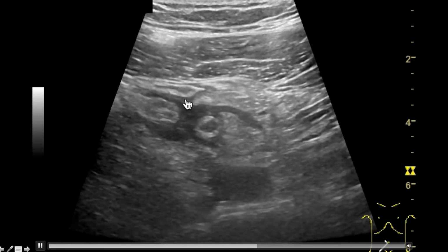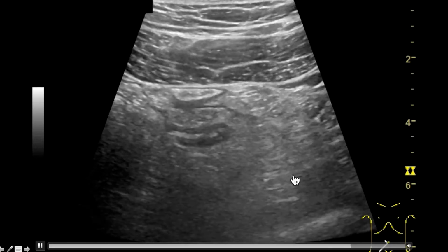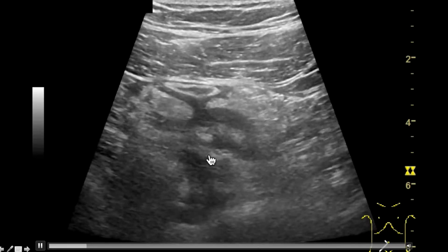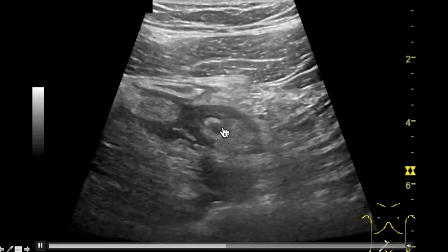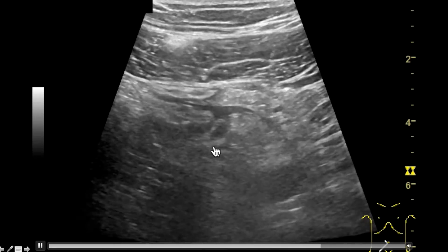And a structure that we do not see but which is almost certainly involved is the right ureter. The right ureter also crosses the iliac vessels in this area. And this inflammation, if it is involved, leads to these erythrocytes in the urine. That is the reason for it.